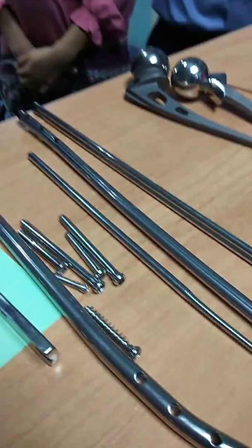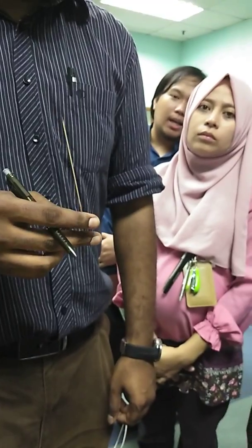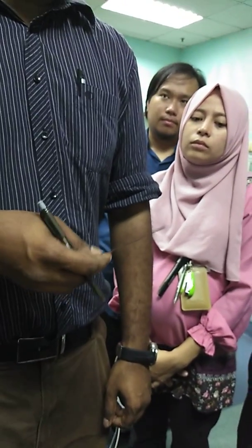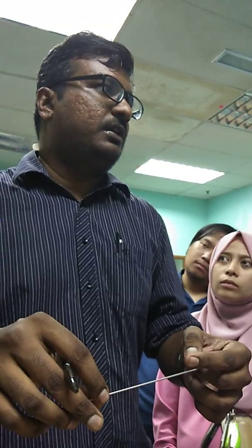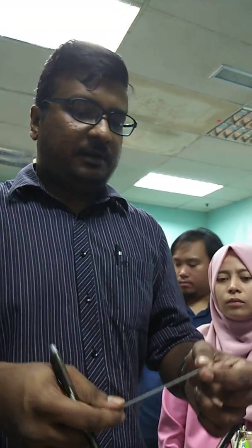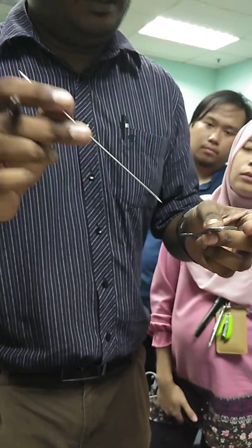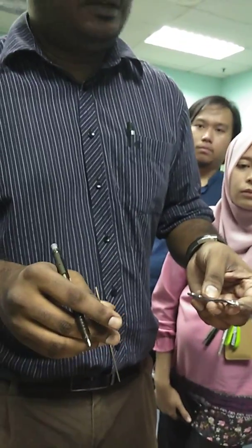What is this? Is it a permanent fixation or a temporary fixation? Can be used as both. Okay? Permanent is like how we saw a patient with the distal phalanx fracture, you fix, and then you allow the bone to heal in 3 weeks. You can see callus already, you take it out. Temporary is, for example, when you want to hold a fracture site. For example, distal end radius is very comminuted, intra-articular is all gone. So you reduce back nicely, you hold it with the K wire, and then you place the screw, and then you take out the K wire. So it's a temporary fixation. Okay.